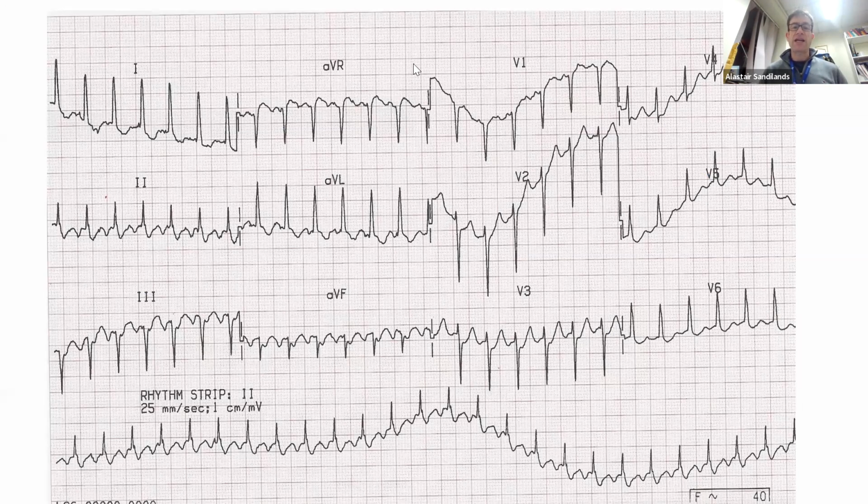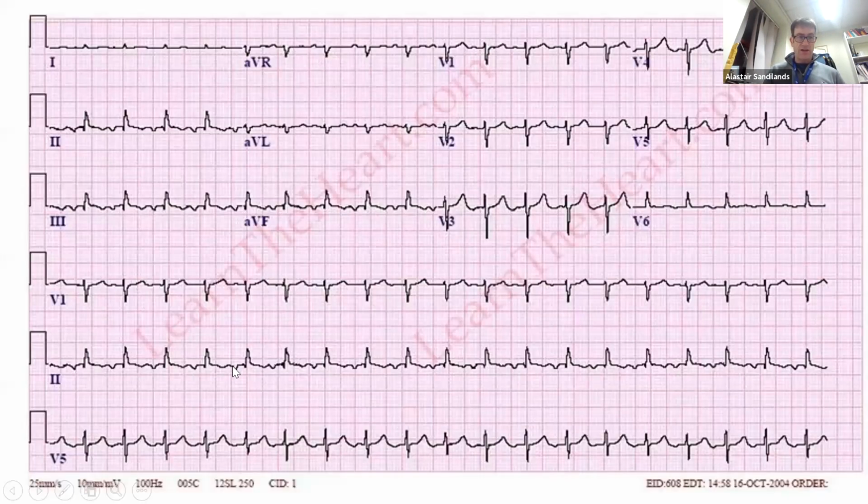So does that mean the atrial tachycardia is due to an ectopic beat? Yeah, so it's just the ectopic beat. When it's just one beat, it fires once. When it's a tachycardia, it keeps firing, ding, ding, ding, ding. I'm just trying to show you on the ECG. The ectopic fires from the atrium. This is driving the tachycardia, this fast beat. So this becomes an ectopic atrial tachycardia. Okay, does that explain that correctly? Great. Okay, so we're moving on.